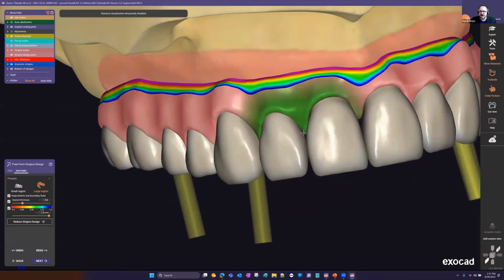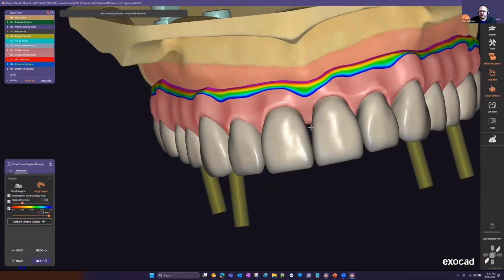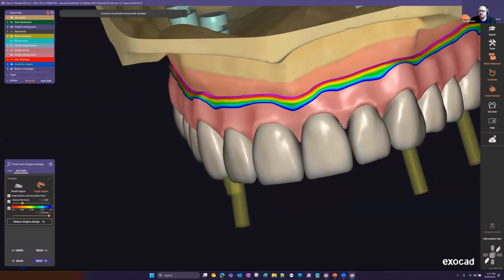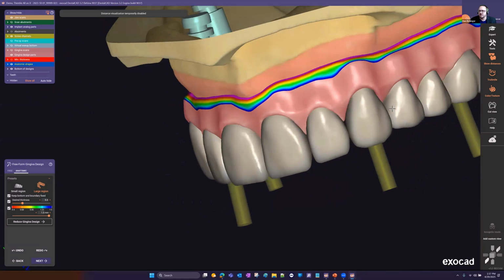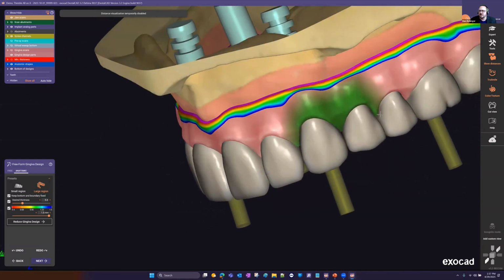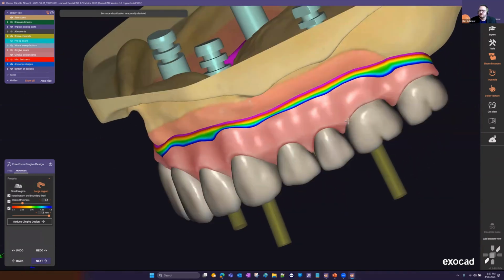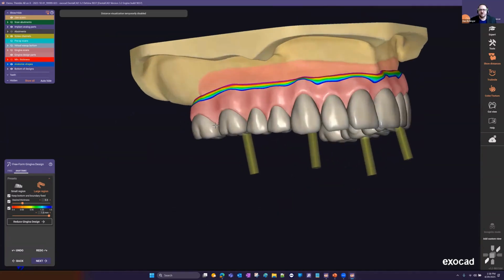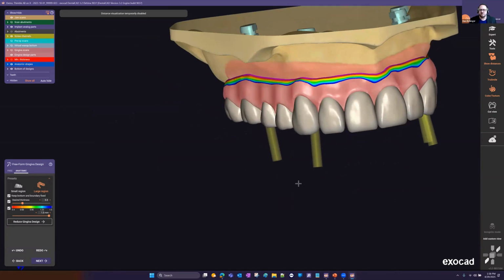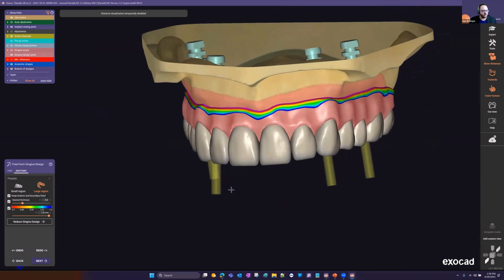simple left click and drag with the large region on the anatomic tab really closes those black triangles pretty quickly. And then from there, it's just add any characterization or adaptation. So the software already gives you some root eminence, root prominence there.